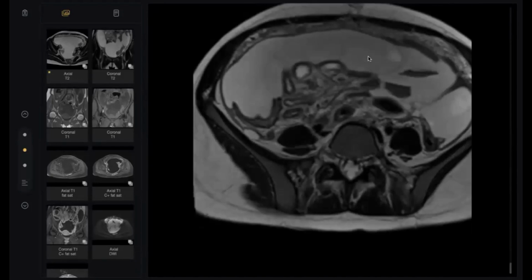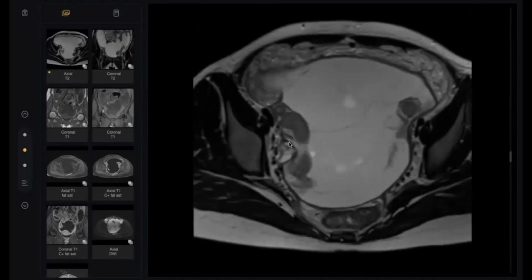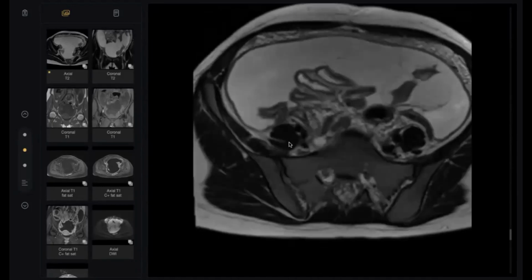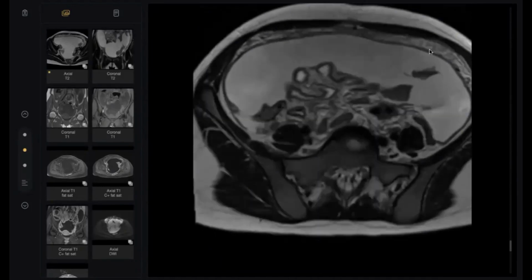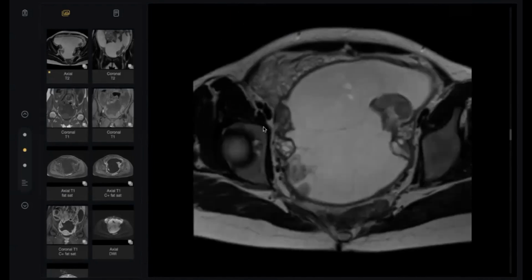If this were a cystic mass lesion, it must exert mass effect, but it is not like this. This is the peritoneum itself. Okay, my colleagues? Is it clear? Thank you, doctor, so much.